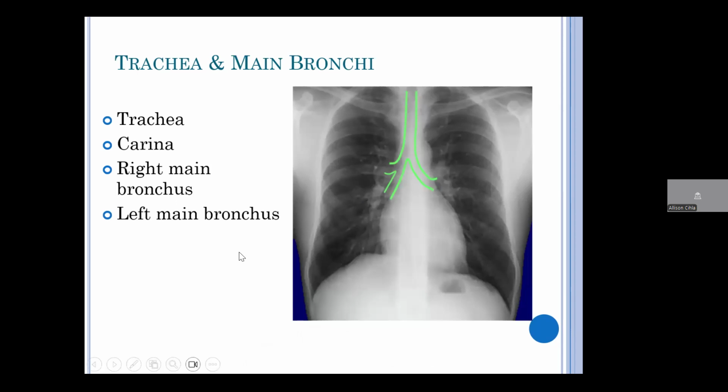We also look for airway abnormalities when we're looking at chest x-rays. You can see the trachea, the main airway, here. When you look at a chest x-ray, you're looking through the trachea, which is full of air, into the spinous processes, which is why this area seems to be a little bit more translucent. You have better visualization of the spinous processes because there is air sitting in front of them.